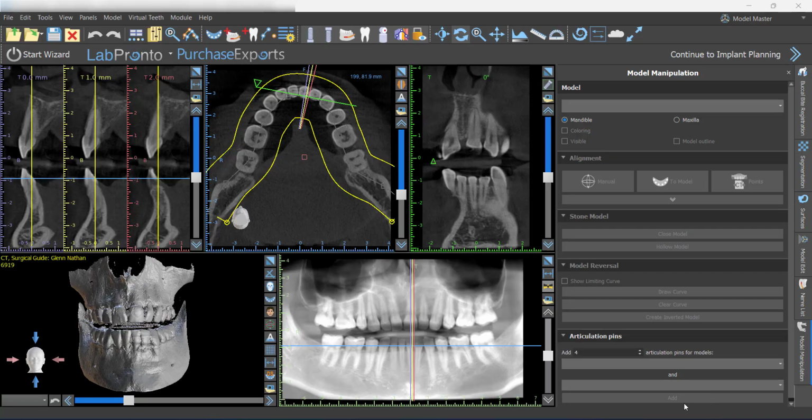Hey, this is Dr. Corey Glenn with Blue Sky Bio, and I want to show in this video today something I'm super excited about. I've been waiting for a long time, and that is artificial intelligence bone segmentation, but within Blue Sky Plan. So you've seen me probably make videos on bone segmentation using AI with some different services, and those work great. But for the longest, I've just wanted this to be fully within Blue Sky Plan.